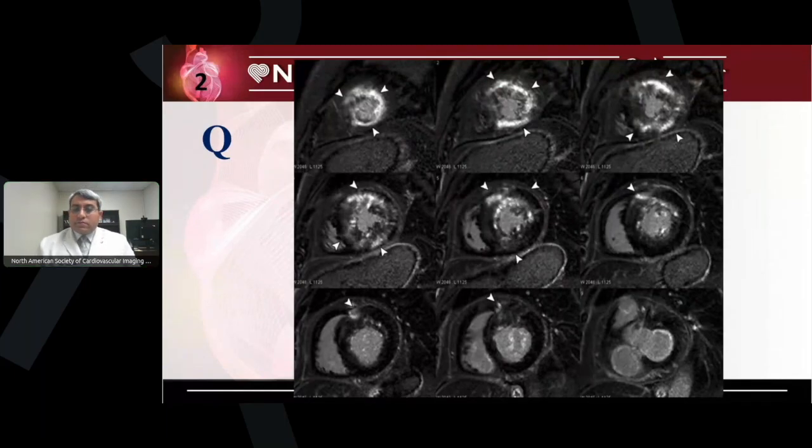So essentially in these patients, we want to see how much of the myocardial mass is enhancing. If there is a certain threshold, usually I believe that is 15%, sorry, I'm blanking on the number right now, but this will make the patient at risk for sudden cardiac death. So we can calculate the degree of enhancement in relation to the myocardial mass.